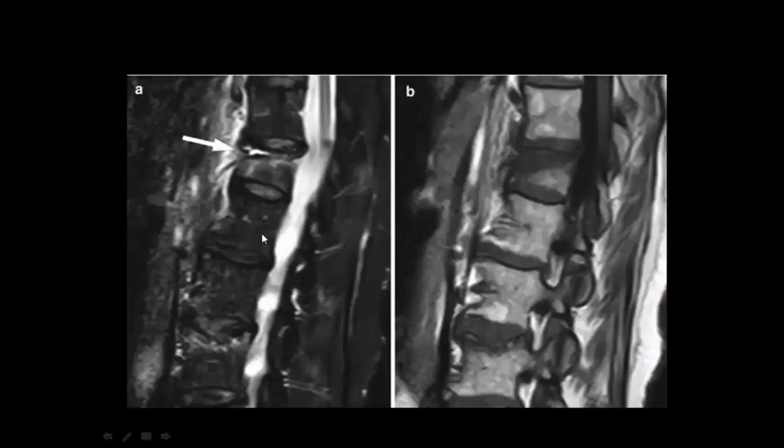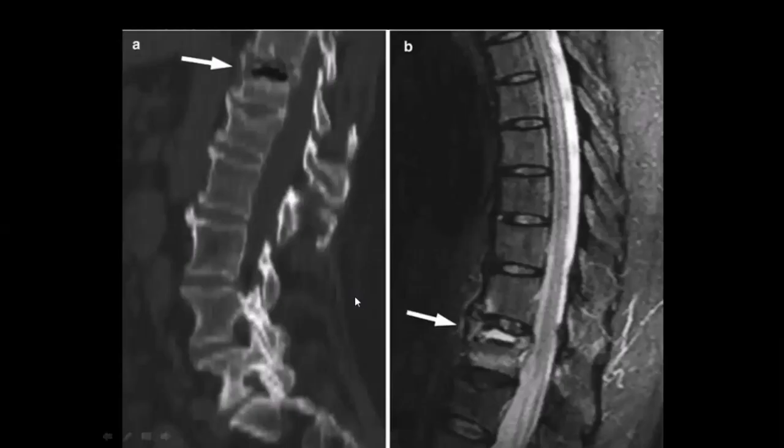From another example, which type of fracture are you going with, malignant or osteoporotic? Exactly, it will go with benign, because you see the T2 high signal or fluid signal in the STIR or T2-based sequence. Whenever you see this sign, you are going with a benign fracture.